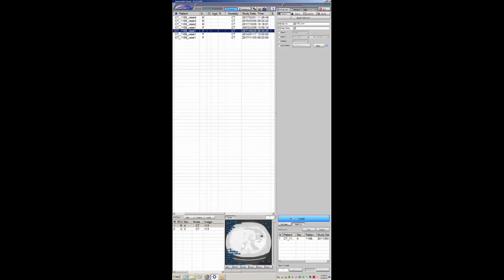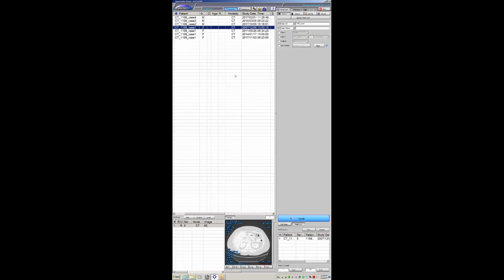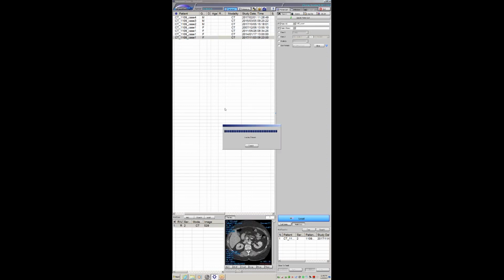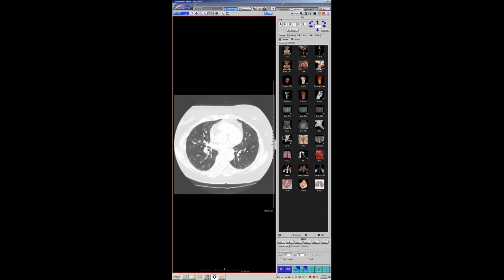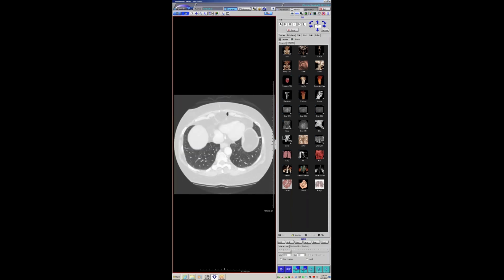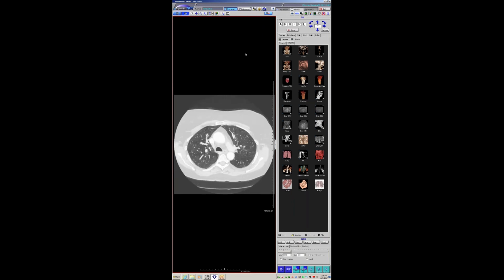And so sure enough, looking at her history, she did undergo wedge resection of multiple of these lesions, and they were carcinoid tumors, and she also had multiple carcinoid tumorlets. And she has a long-standing history of quote-unquote asthma. So this is a case where in the scan before this, I called it mets unchanged, but in reality, it was DIPNECH. So a nice kind of case of that.